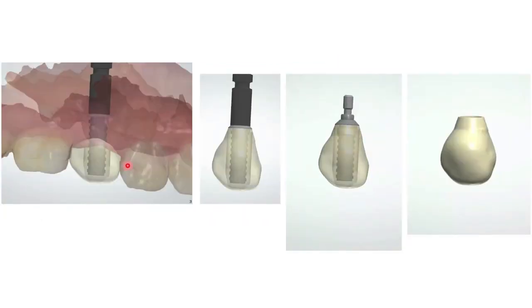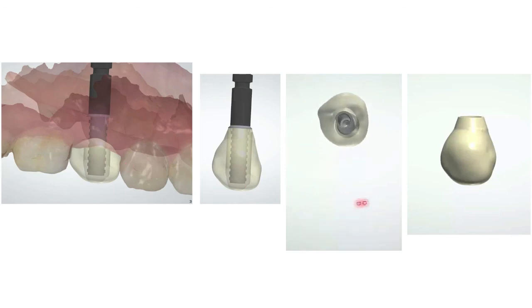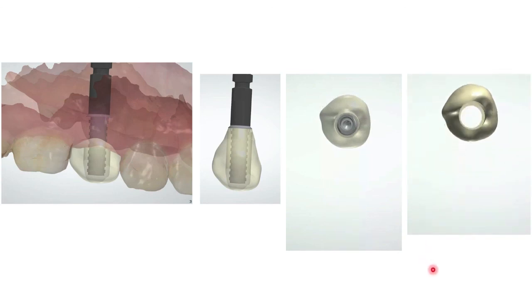Okay, so here's the workflow. Implant position's been imported. Provisional's been designed. Provisional component's been selected. And it's all going to work. And there's our provisional. So these are the things that I'm going to get back from the laboratory.